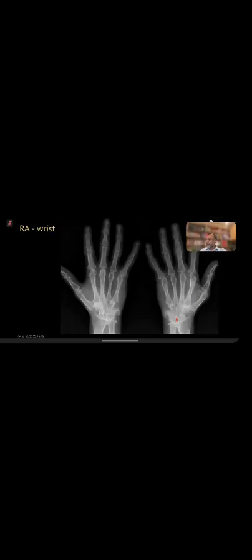Okay, so look at these two X-rays. Maybe some erosion there, not sure, but look at the erosion here of the triquetral bone. Another erosion on the opposite side of the same patient. Again, erosion on the ulnar side. There's erosion of the styloid process, a big erosion. This side is not eroded, looks like chronic erosion there, but of course the patient has other erosions as well. So this is established erosive change in the MCP joint and the wrist joint.